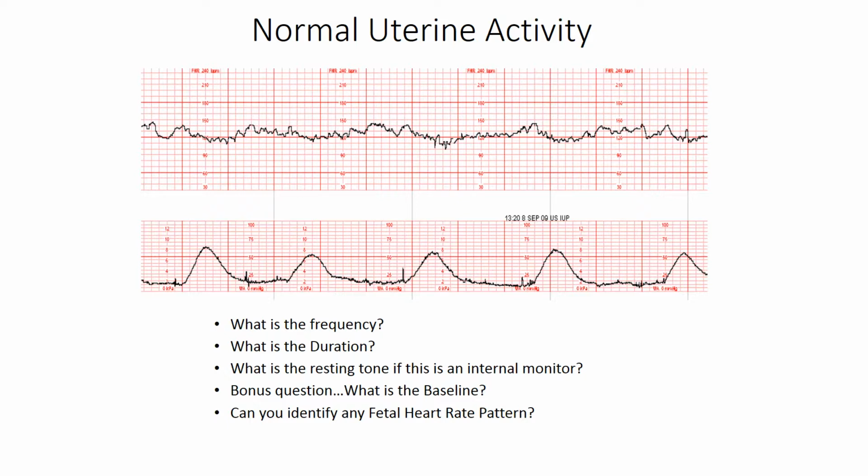And as we look up at the baseline range, we're going to say it's about 120 to 130, a term we're going to learn about in a minute, moderate variability. And I would document it at 125 because I'm looking at it again in between contractions.